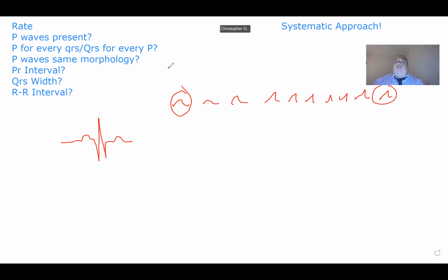So that's going to be the difference between a flutter wave and just a regular P wave. And I know it seems kind of subtle, but when you see them, they definitely have a different morphology, okay? And when we start looking at EKGs, guys, and doing actual practice with strips, you're going to see the difference, all right? So let's draw something out here.